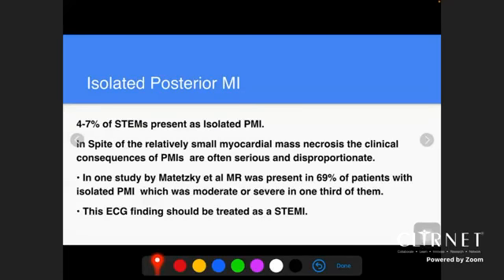We advise usually if the surface ECG is not diagnostic and the patient is having chest pain, please do right leads and the posterior leads and carefully look at the posterior and the right leads, because you can only find the posterior ST elevation in the posterior leads. Sometimes you cannot see it in the anterior leads. Sometimes it will show like depression in the septal leads with positive R, sometimes not, only at the posterior leads. The clue here is the patient is symptomatic and the ECG is non-diagnostic. Go for serial ECG, go for right and the posterior leads, go for echo bedside and troponin.